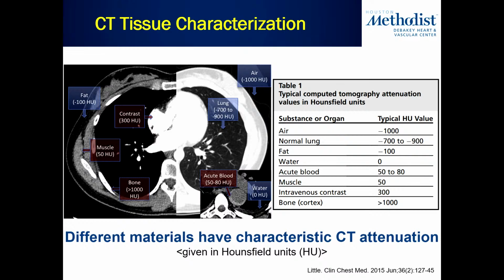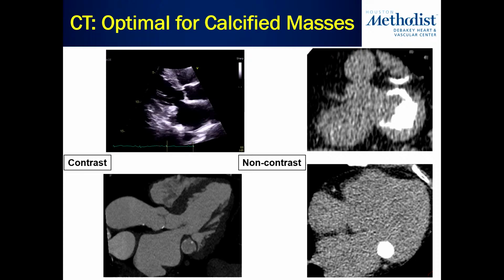Now, where we have difficulty is in the soft tissue range. But there are a lot of masses that you can very easily rule out with CT. Carla showed cases like this, and I'll just show you what they look like by CT. This was a case by echo, again, that very tuberous calcified structure there on the lateral annulus.